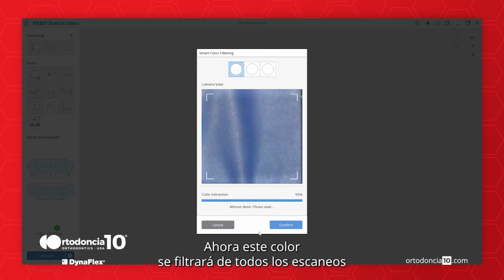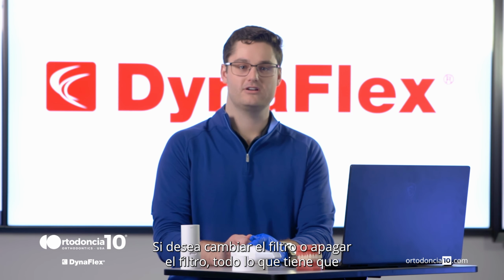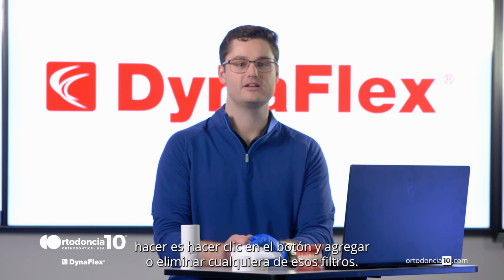Now, this color will be filtered out from all patient scans that you do from here on out. If you'd like to change the filter or turn the filter off, all you have to do is click the button and either add or delete any of those filters.